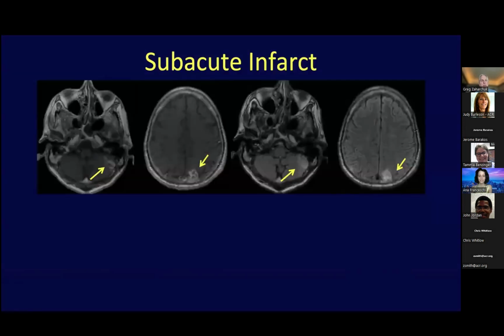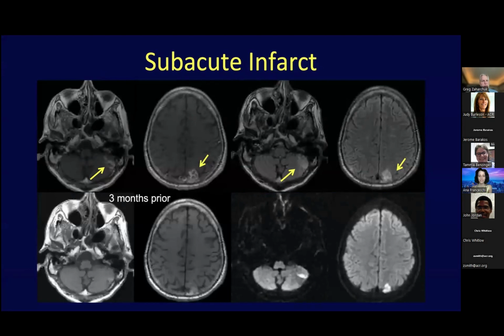Another thing that you might worry about is subacute infarct, because infarcts can show up in very different ways. You can have things that are asymptomatic in older patients, as we know. We saw an example of that, and we've definitely seen examples of that at our institution. But again, this is where having diffusion and having a follow-up available is very helpful. So again, we don't typically give contrast, of course, for the ARIA examinations, but if you did, often in subacute infarcts, you will see enhancement.